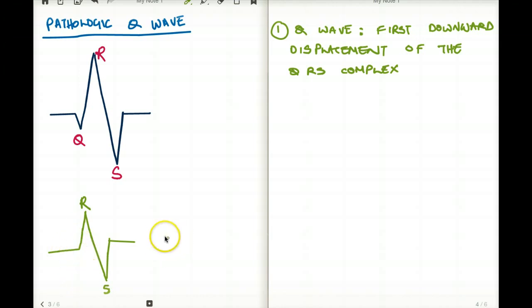So what if the EKG looks like this? After a P wave, this is all you see. What is going to be this wave? Well, we know that both Q wave and S wave have negative deflection. What kind of wave is this one? It is a little confusing, right? We don't know which one is which. We have two negative deflections, Q wave and an S wave. Therefore, this kind of wave is called a QS wave.